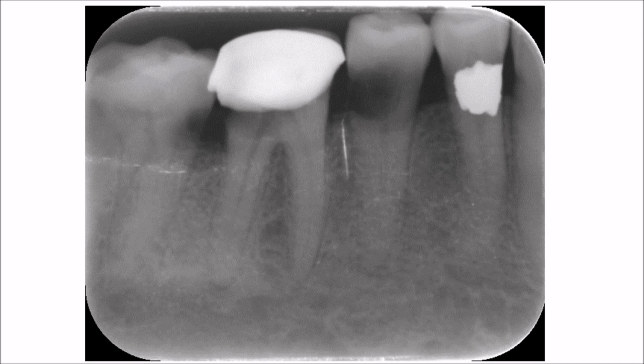Another cavity, root caries, has affected also the buccal surface of the lower seven. Why would I say the buccal, not the mesial? Because if you trace the root surface, you will see that the root surface is still continuous. So it means that there is no discontinuity in this surface, but the cavity or the radiolucency is present on the buccal surface of the tooth.